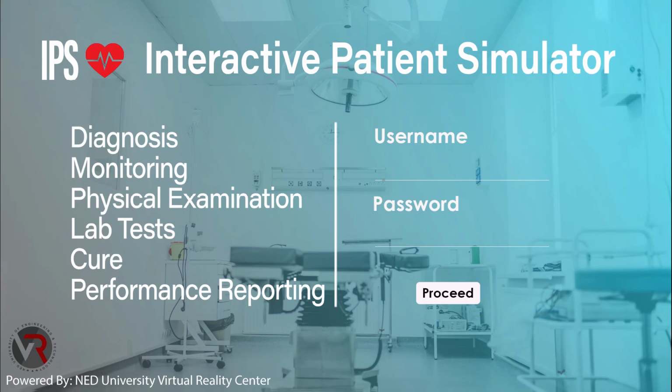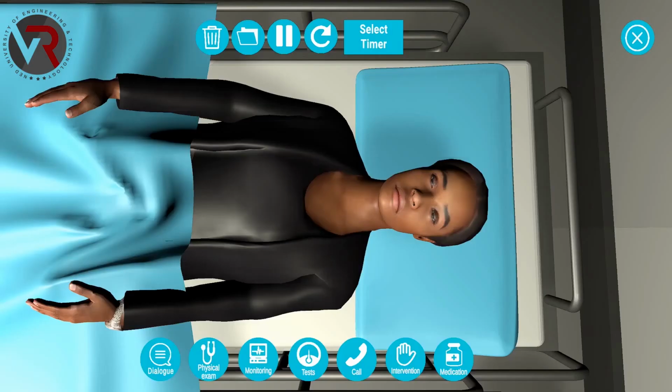The interactive patient simulator is a medical tool for training and assessing trainees and doctors for clinical scenarios in an emergency room environment. It involves assessing the patient's medical condition, performing some medical procedures for diagnostic purposes and finally making a differential diagnosis on the basis of which a report is generated. The report determines the accuracy of the assessment made and reflects the doctor's efforts.